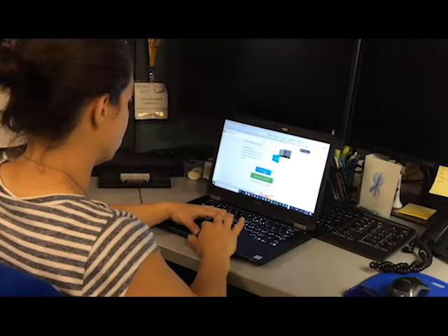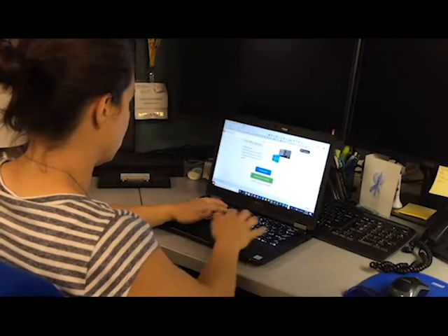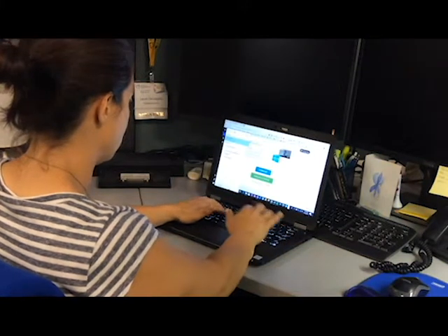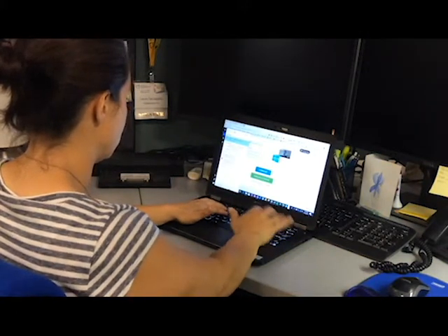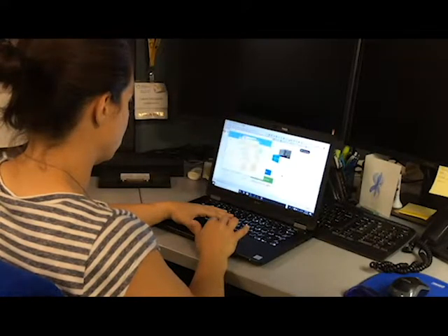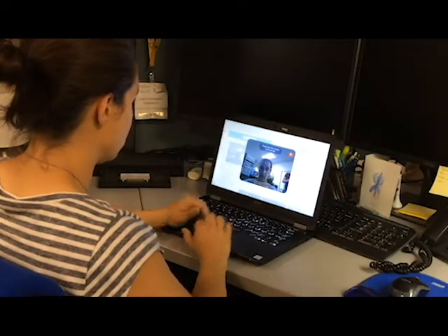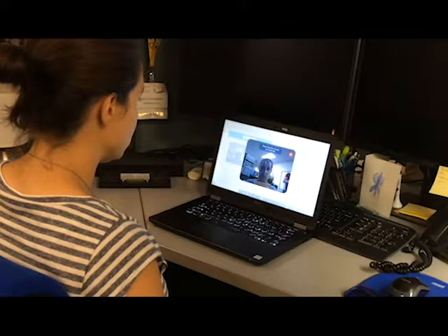Open Sesame can also be used on Android tablets. Additional specialized devices are not needed to run the software since Open Sesame uses the built-in or added webcam to track your head movements. You will be prompted to look at the screen when Open Sesame starts up. This allows the software to learn your face and movements. Now you are ready to navigate using your head.